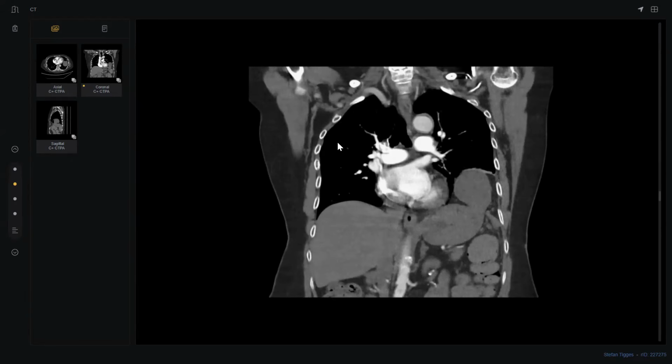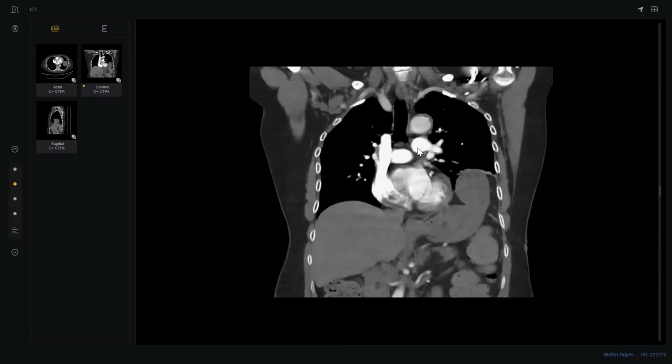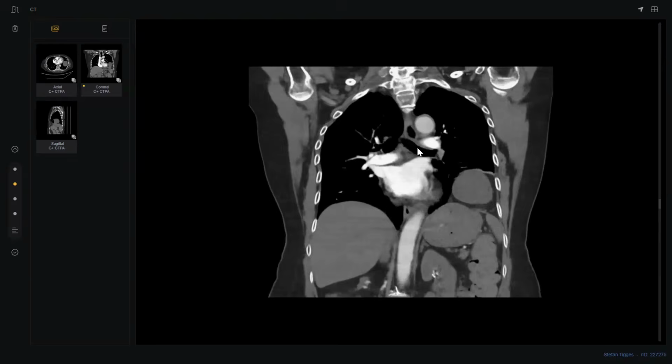This could be due to thrombosis of the vascular supply, or maybe a vascular injury. No, because this is a CT pulmonary angio. You can't assess the bowel. Very easy. So I told you, please compare the herniated bowel with the non-herniated bowel and the other organs. This is my advice for you.